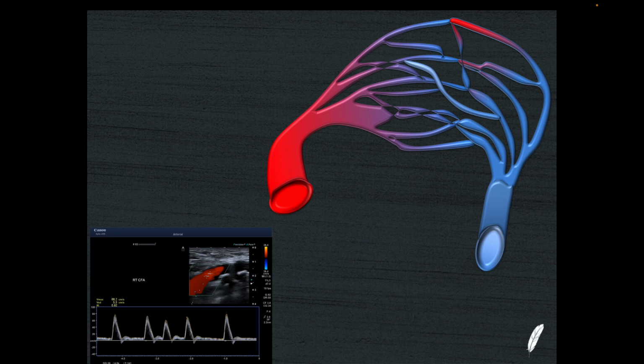If you look at the construct of a pulse Doppler waveform, you can break it into systole and diastole components. The systole component is at the beginning of every left ventricle heartbeat. You can see the way the blood rushes forward, and it has a very short acceleration time. You can see the very steep rush to peak systole there. And this first component of the waveform is governed by the left ventricle output pressure and that pressure wave arriving at the point where you're insonating the arterial system.